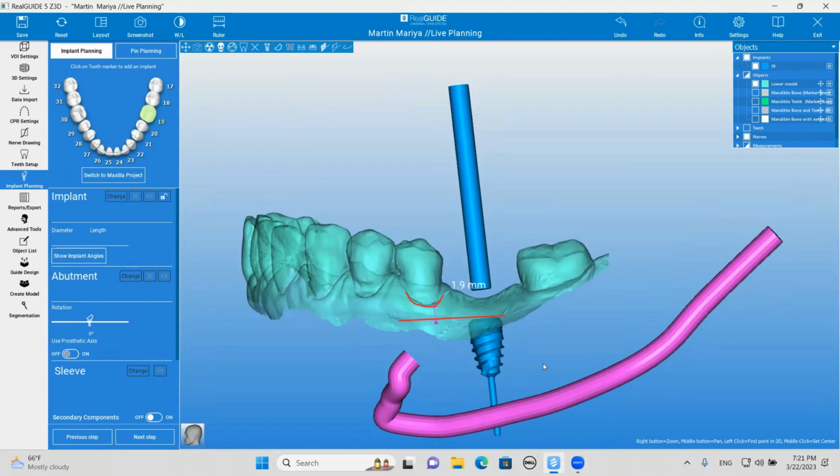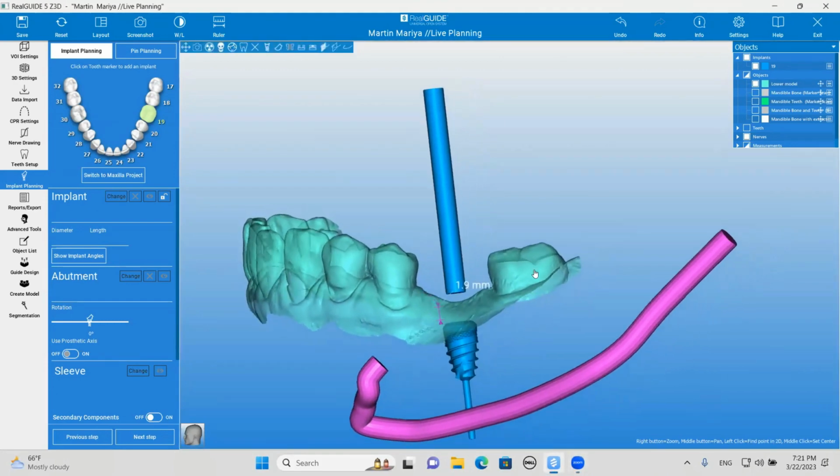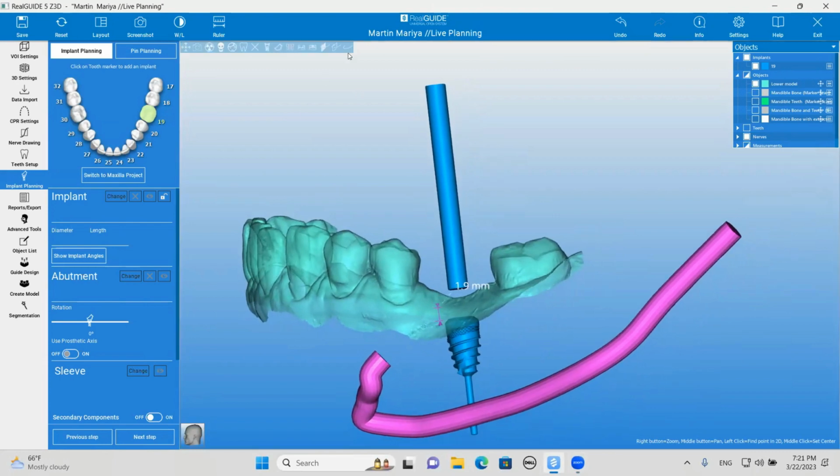A couple little recommendations. Hussein, could you move that 3D model so I can show him the contact areas? Oh, absolutely, sir. Scott, one problem you have with these single edentulous sites, especially when they've been edentulous for some time, is do you see the mesial of the molar and the distal of the bicuspid?